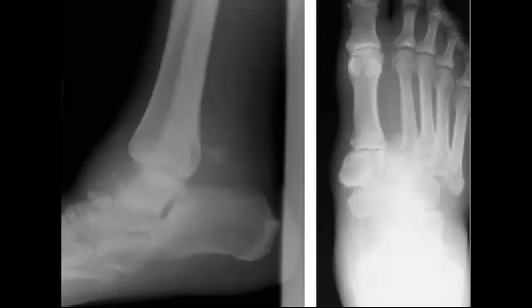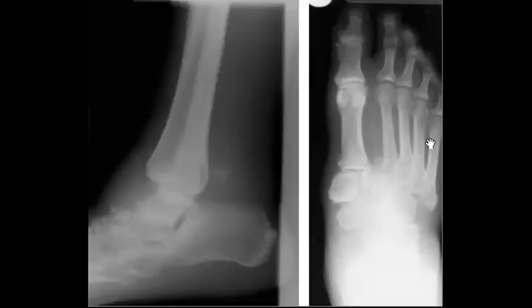And you can find something here in this image. What is the most striking finding here, plus the Charcot joint? Yes, Zoom user, thank you. Lisfranc. So you can see the Lisfranc dislocation here. So Lisfranc fracture and dislocation. And we mentioned that in Lisfranc you have two types, either divergent or convergent. So this one, which type?